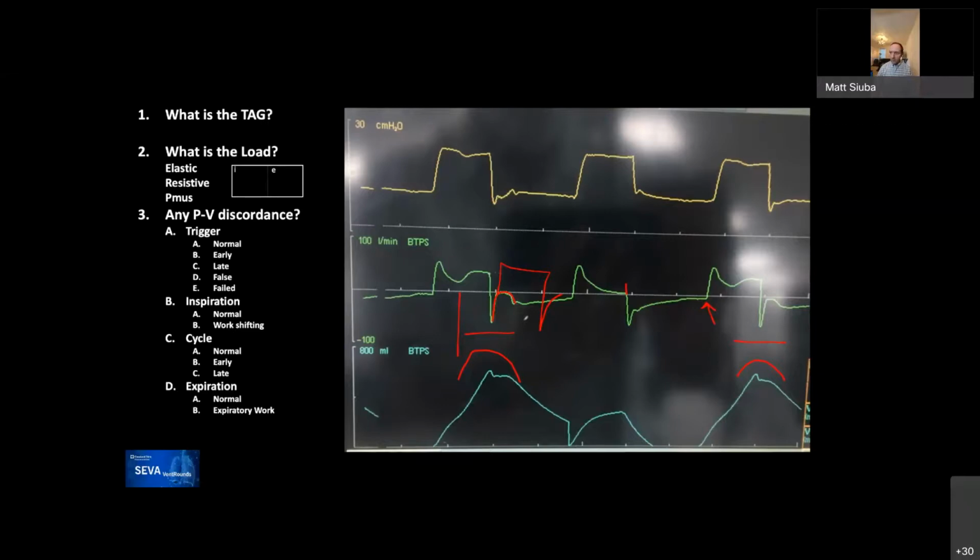All right. Another question: is there a leak since the volume time graph resets? I think we just didn't finish exhalation there. Right, that's all that was. Yeah. The next breath was scheduled to happen, and the ventilator just resets the graph. You're right, it does look like a leak, but in this situation, that's not what's happening.